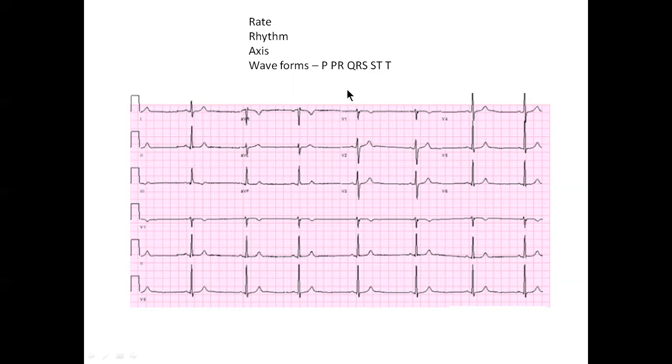Now, this is one thing I didn't share with you before. After you have looked at the QRS and decided that it's normal, it's best to look at the QRS, ST, and T together in the distribution of the arteries. So 1 and AVL usually indicate the circumflex artery. So we quickly look at QRS, ST, and T. They look pretty normal. So 1 and AVL look pretty okay.